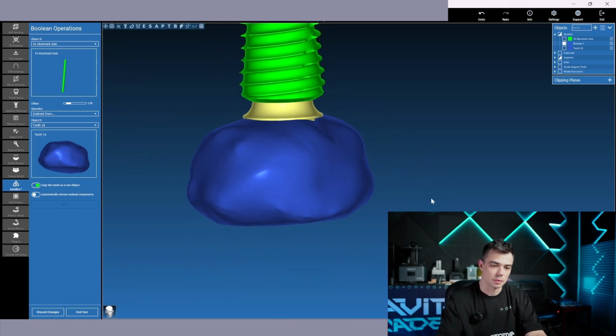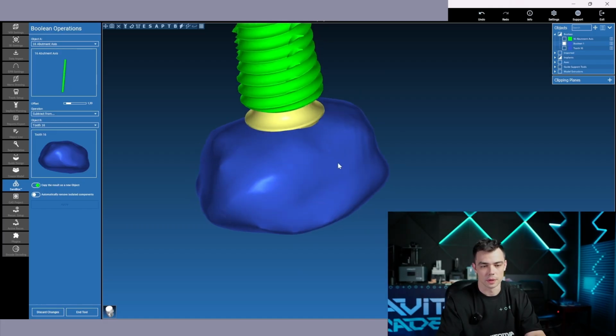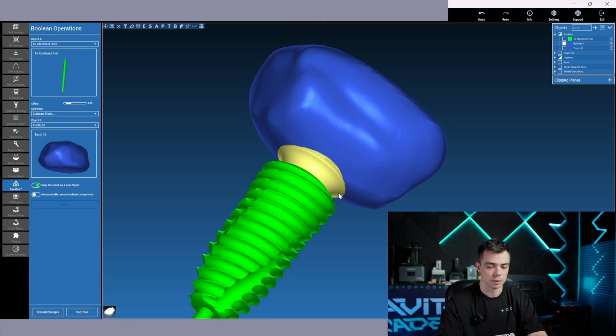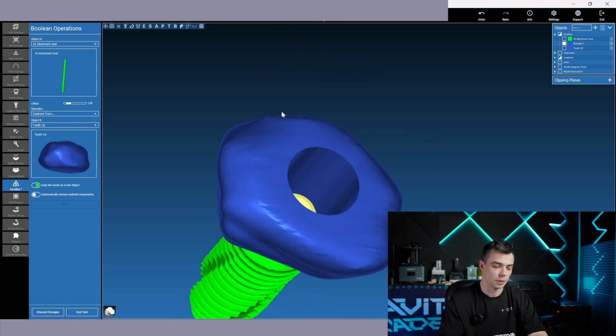That's the first thing. And the second thing, please polish this area, because it has to be polished, and it's also really important for the future healing. Since you have printed this individual gum former with a surgical guide resin, you will have an opportunity to autoclave it, to sterilize it, and to safely insert it on the implant to make the shape of the future crown perfectly as it was with the existing tooth.